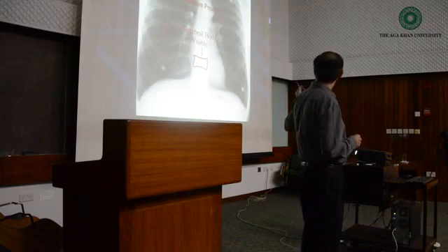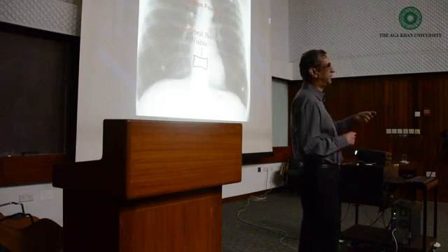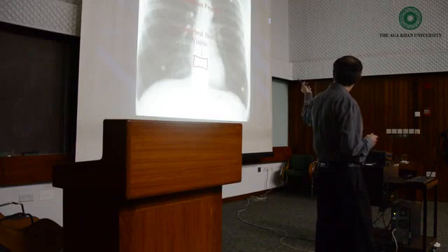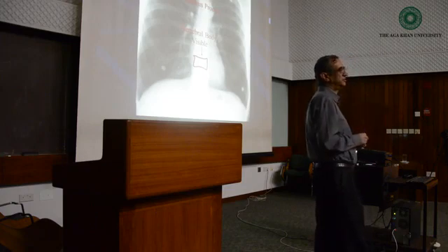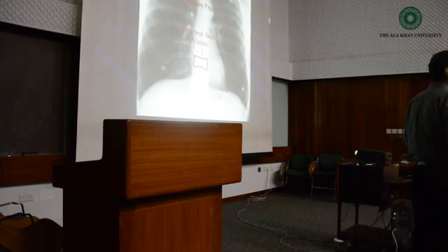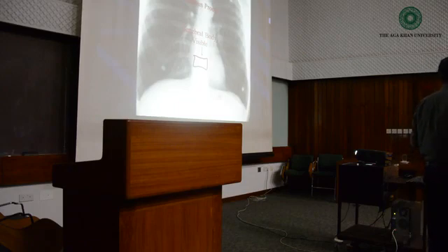Fewer X-rays would go through the body and fewer would reach the film, so it would be too white. And if you give an overdose, again, you know it's harmful, with side effects. If you give too much, then the vertebral bodies become too easily visible, and the lungs become too black because too much radiation has gone through. Have you understood this exposure thing? It's similar to dose, and the best example is medicines given to patients, the tablets or syrups. You always want to give an adequate dose, not less and not too much.